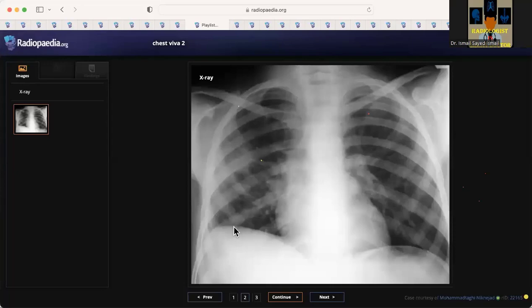I think that these nodules are related to the ribs. As I can see, their borders are fading away from the ribs, they are in continuity with the ribs. Also, I can see prominent hilum at the left side. The costophrenic angles are normal.